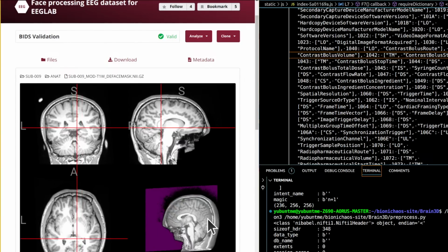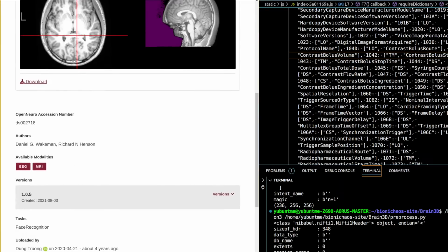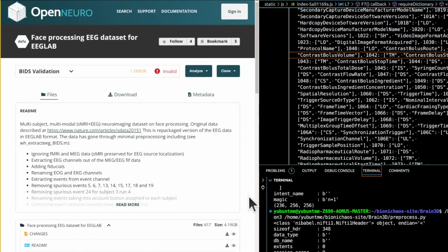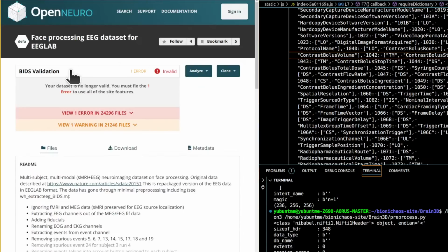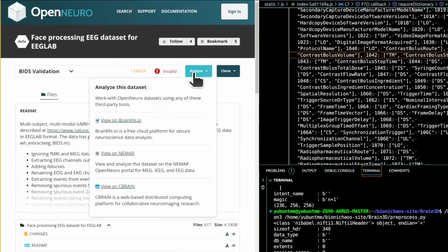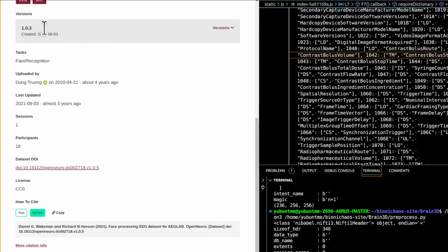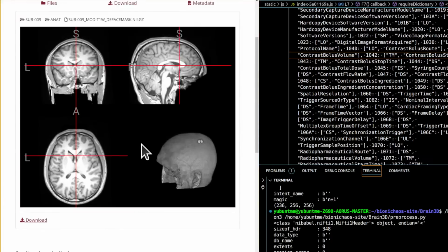Structure of openneuro.org 3D brain viewer. 1. Front-end components. JavaScript libraries: utilizes specialized libraries for medical imaging, e.g. cornerstone.js, niview.js. WebGL for rendering: uses WebGL to render 2D slices and 3D volumes interactively in the browser. WebAssembly (WASM): may use WASM for computationally intensive tasks, enhancing performance. 2.